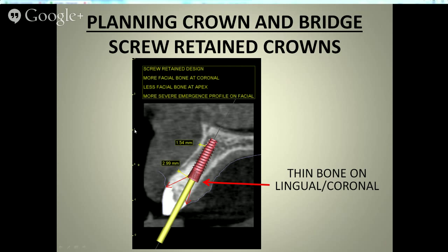So, when you have a crown like this that has this much anterior contour to it from the implant, you can see the emergence profile that we're left with. Now, that doesn't mean it's wrong, but it means that you may have some tissue contouring to do, or some tissue modeling to do with the provisional crown, as opposed to not having to do it if we had a different kind of an emergence angle. But if you design the case for screw retain, and that's what you want to use, quite often this is the result. So your laboratory has to know how to handle these cases.